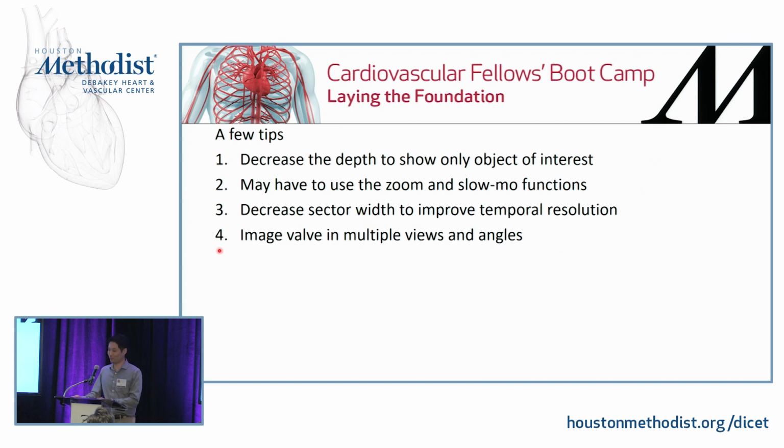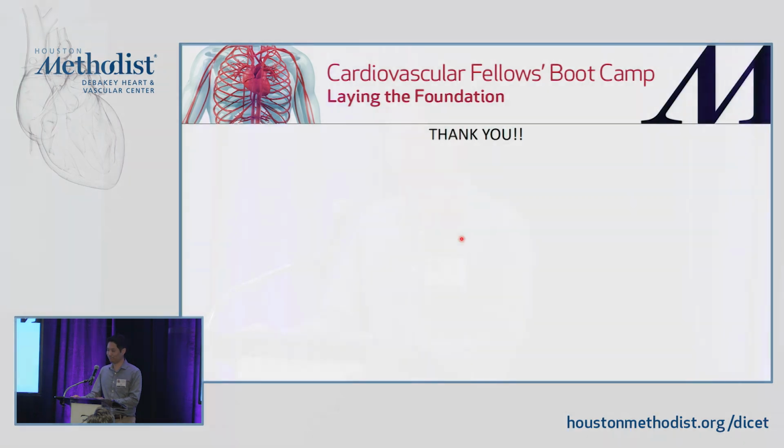And finally, image your valve in multiple views and angles. Okay, thank you.